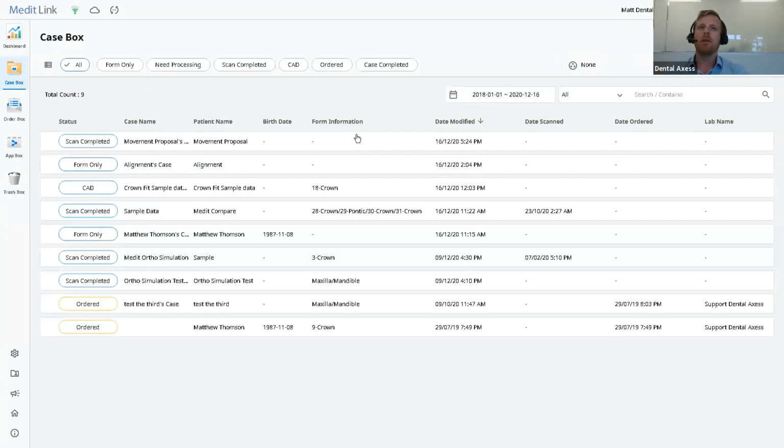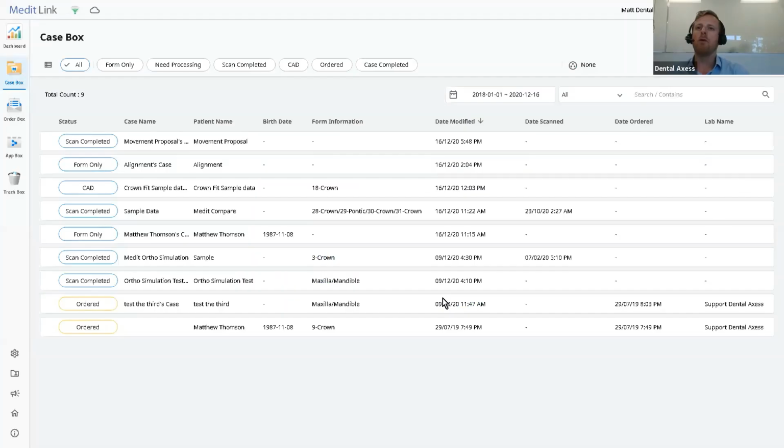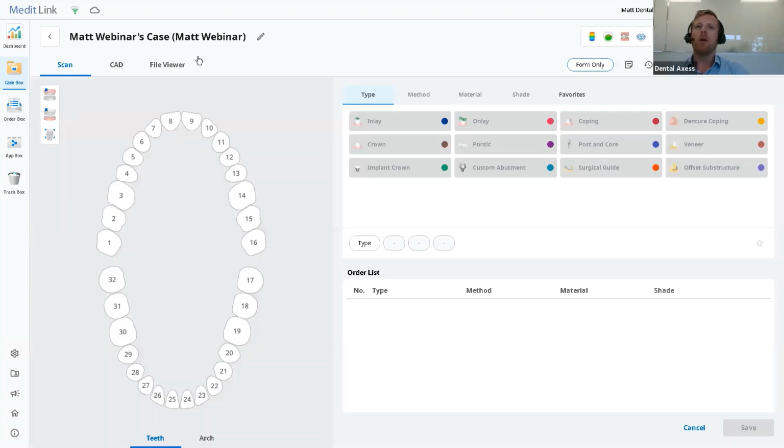Next up, let's have a look at Smile Design. So what I'm going to do now, I'm going to make a new case, and I'm going to say Matt webinar, and I'm going to say register. Then I'm going to load in a photo. I'm going to use a photo of myself because I took one earlier this morning preparing for this webinar. So I'm going to open up the case.